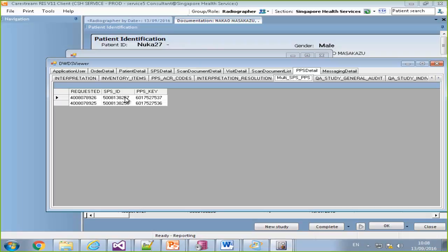So you actually want two separate radiation doses for each procedure, right? In that case, you don't document those together. Just because a document together capability exists, if a document together group is not defined for a study, it cannot be documented together. So in that case, they have to be done separately.